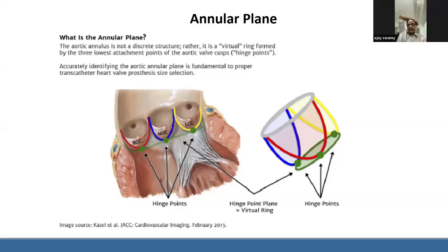But now recently I've learned that if it is diastolic, then I say, okay, show me what is there in systole. Then I will pick the images of the annulus that I need. I will use the systolic for the annulus, and I don't mind the diastolic for the coronary heights and other things. But I will use the systolic if the annulus images are good.